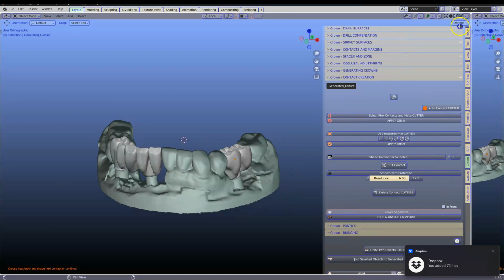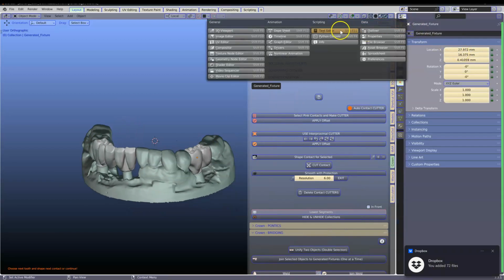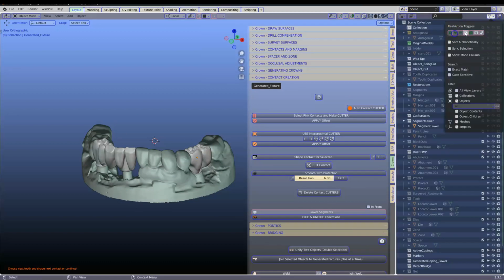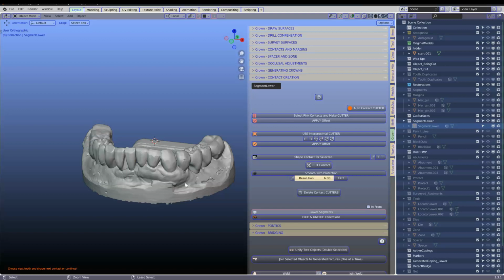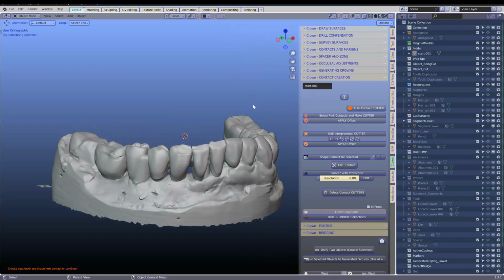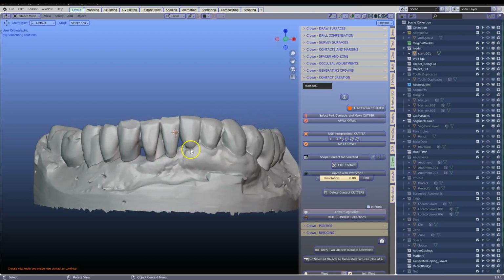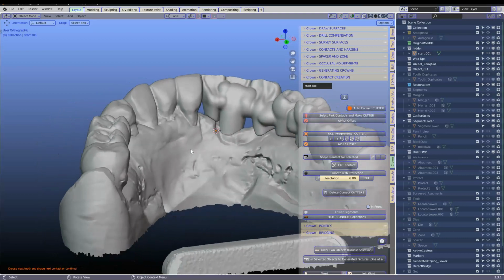Alright, we're going to expose the other one, my hidden one. And I'm going to take this one away or just hide it for now. And this is what my finished result looks like. We could still add a little bit underneath here just to close those gaps. But I think this tutorial is sort of finished.